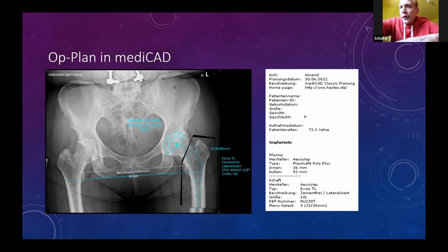I can plan the case in 2-3-4 minutes. The result is in many cases the same as what I have planned. I only need this paper with the result. I will read it before I operate.